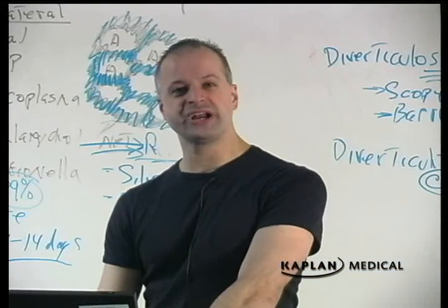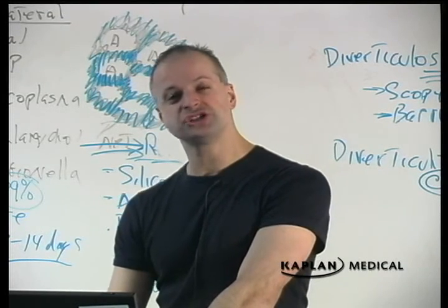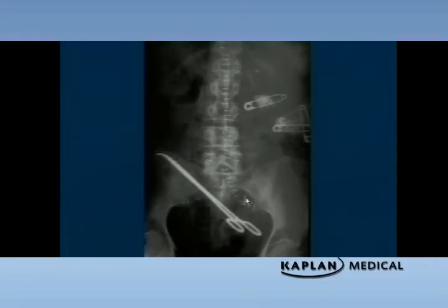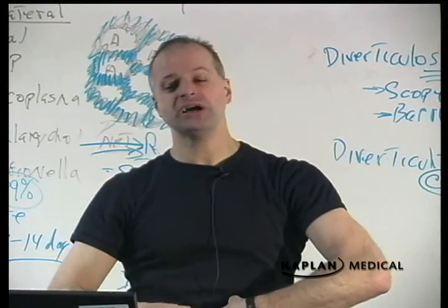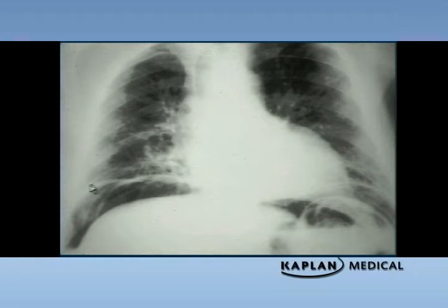What's it from? You don't know. It could be a perforated duodenal ulcer, gastric ulcer, perforated this or that. It could be a stab wound, a gunshot wound to the abdomen. It happens to be this patient post-operatively. Everybody who's getting cut from their pubic symphysis up to their xiphoid process and has had their abdominal contents investigated is going to have air under their diaphragm. That is a normal post-operative finding to have air under the diaphragm after abdominal surgery. That is a normal post-operative finding.